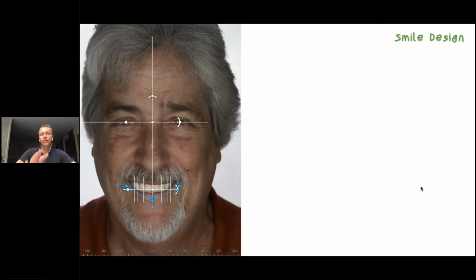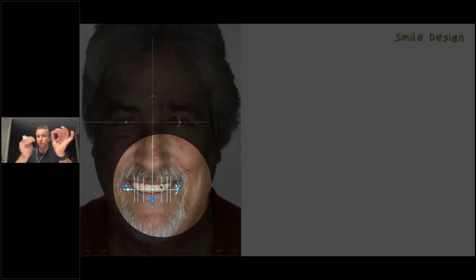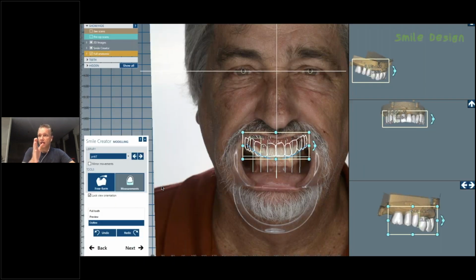of the face. The computer usually gives you the midline, and that's a symmetric midline. And as you remember from the very beginning, not one patient or one human is symmetric. So it's also important for us to look at this photo and decide where we're going with these lines, where we have to move. And you see here all these little rulers and arrows, we can move that, we can even tilt it slightly if we need to, so we can adjust that. These lines don't force us to do something, they just give us directions where we can move the teeth.